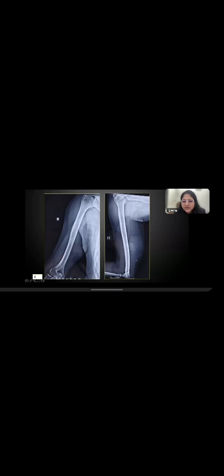Few of these calcifications have a central lucency. So typical of phlebolith. Absolutely. Dr. Zainab has absolutely nailed it. And these are phleboliths. So this is an AVM in the arm. And the bone is absolutely normal.